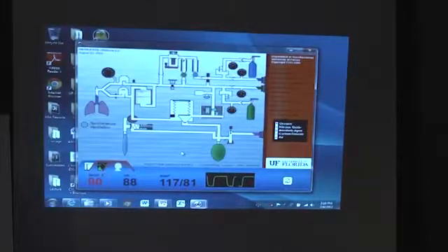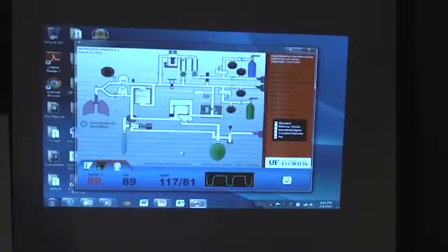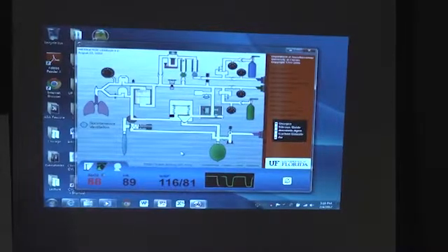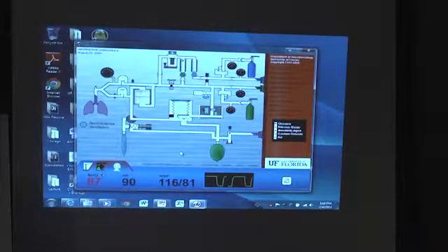So that's confirming. But the other thing to remember, this is important. The oxygen analyzer alarm came much earlier. So it's an early warning, whereas the pulse oximeter came much later. That's why you want a functioning oxygen analyzer on your machine. When the pulse oximeter alarm sounded, you have used your patient's hemoglobin as the sensor, haven't you? If I was your patient, I wouldn't want that. That was your first inkling that something went wrong. So what should we do?